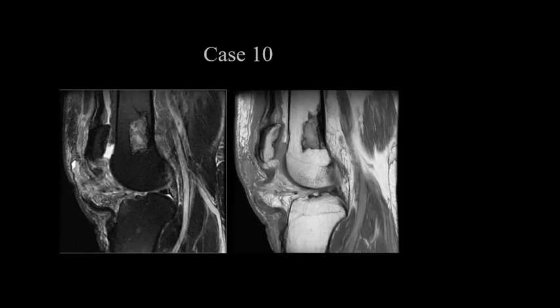I don't have idea. Okay, so you described the changes here in the femur. What do you think this area is? This abnormal area is? يعني contusion. أنا ما دا أشوف يعني segment يعني bone segment avulse, mostly contusion.